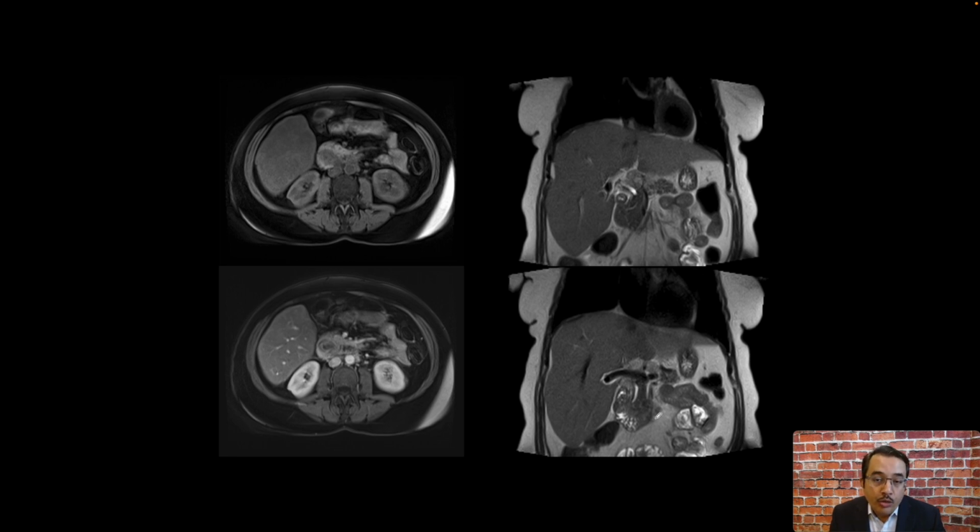This slide shows two interesting findings in the pancreas, incidentally seen in a patient. On this T1 fat-sat non-contrast enhanced image, we see normal high signal of the pancreas. In the head, there is a focus of low signal. Look at what happens to that on contrast enhancement. It enhances like bowel, so it's the second portion of the duodenum that is encapsulated by the pancreas, so this patient has annular pancreas.